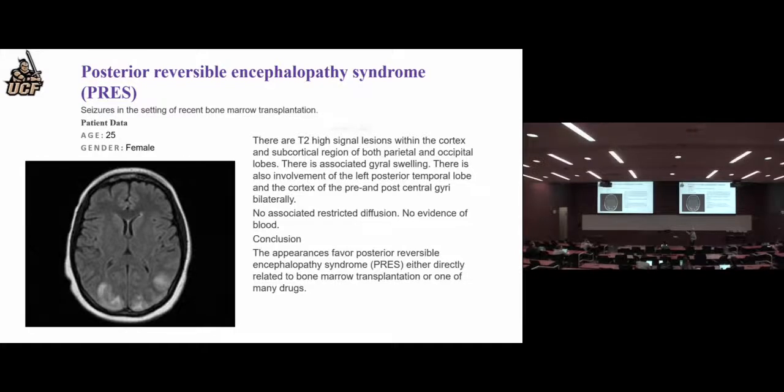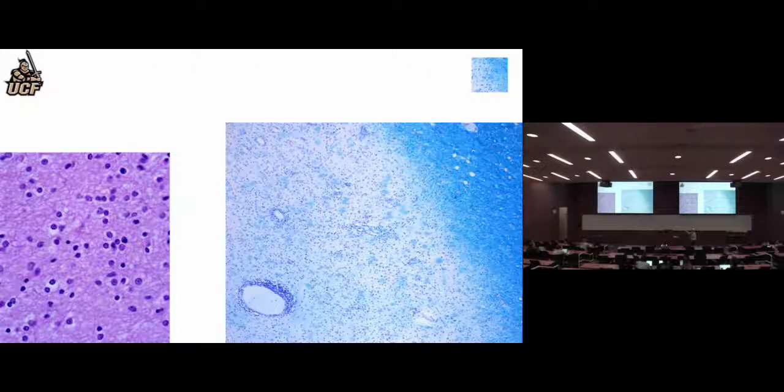You'll notice, I was playing around with this. You just sort of grab the corner and pull this thing out until it's real big, and then you get something that looks on the good side. It looks very much like this, except it's a little different color. I was trying to change the color. I couldn't get it to that color, and then you see the demyelinated.